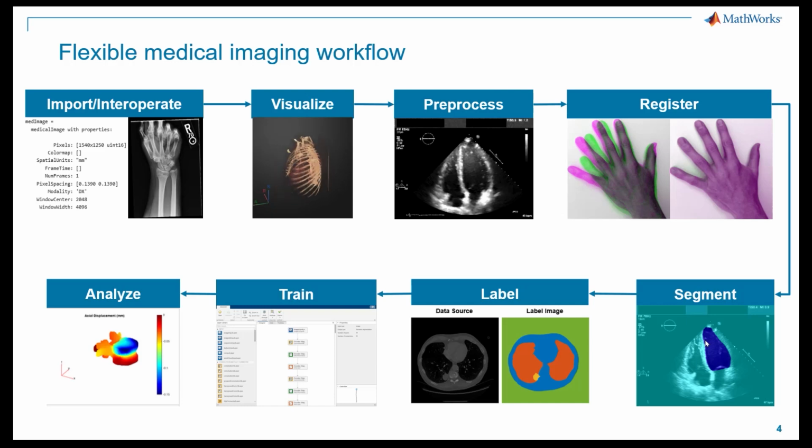And here I include with the idea of import the idea of interoperate, which we'll talk a little bit about. But you need to bring in your data from wherever the source steers you to, and you might need to interact with third-party tools to do that. We'll talk about that. And once you have your data in, you'll need to visualize them. Once you can see things after you visualize them, that gives you a sense of how you want to approach the problem. That might include some ideas of preprocessing, highlighting what you wanted to find in your images.